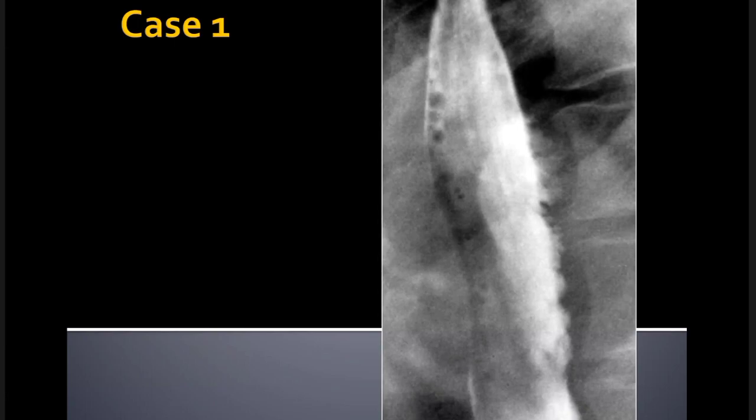So basically, you've got this area, as you pointed out, of quite long area of ulceration. It's in the mid-esophagus. And the key thing here is that all these ulcerations are quite deep, okay? They go quite a fair bit beyond the contour of the esophagus. So you've got the esophageal wall here, you've got the smooth outline of the mucosa here, but then you've got all these projections into the wall. So these are deep ulcerations, they're confluent. This was actually inflammatory in nature.